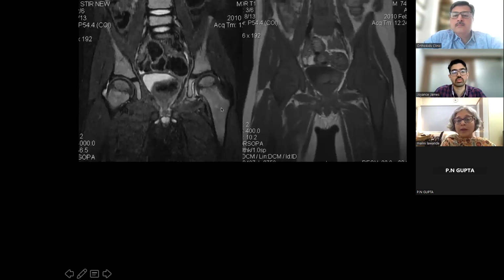And then one more, which I think is very important, which can be missed if one is not careful. When I look at this MR, it's very hypo. All the bone looks very hypo. Remember, as soon as the ossification center is formed, it is fatty and it remains fatty throughout. Here, the epiphysis also in this child just came with some minor trauma, fell off a swing in the school. And you have diffuse dark T1 weighted signal, T1 weighted image hypointense signal, which is bright on STIR.